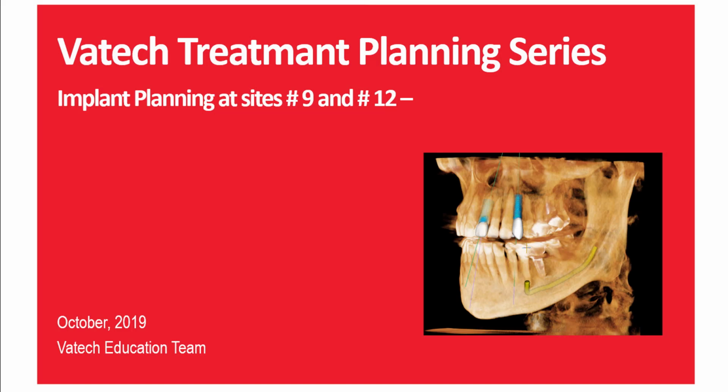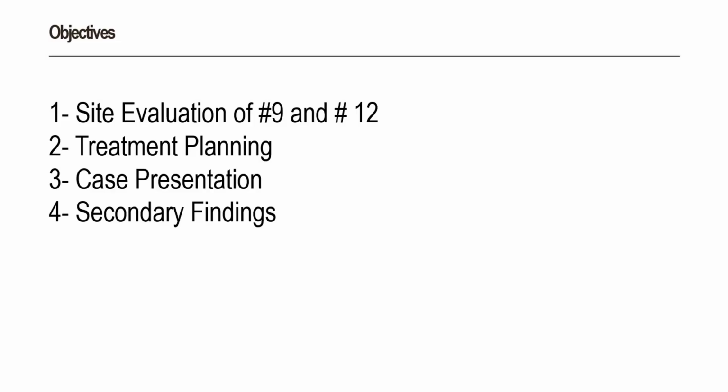Vatech Treatment Planning Series, Implant Planning at Sites 9 and 12. The objectives are: perform a site evaluation of 9 and 12, generate a treatment plan, do a case presentation for case acceptance with the patient, as well as identify secondary findings.